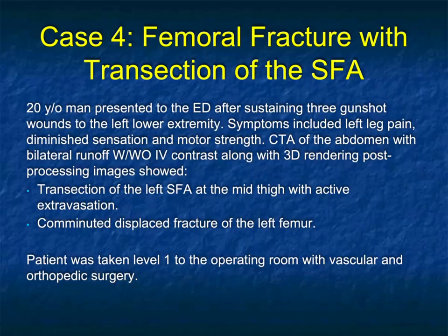Another case, femoral fracture with transection of the SFA. It's a 20-year-old, came to the ED, had gunshot wounds to the lower extremity, symptoms, leg pain, diminished sensation and motor strength. CT of the abdomen with bilateral runoff studies showed transection of the left SFA at the mid-thigh with active extravasation and a femur fracture. Patient was taken immediately to surgery.